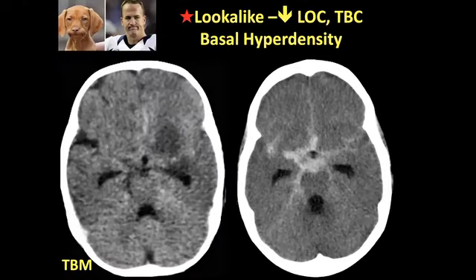And just a lookalike, don't forget, not all basal hyperdensity is TB, because in this patient we have a subarachnoid hemorrhage.